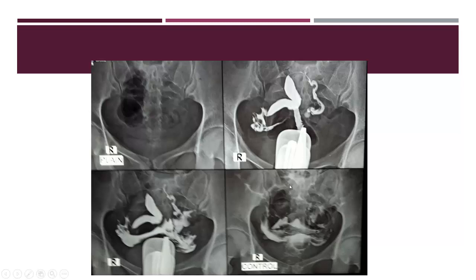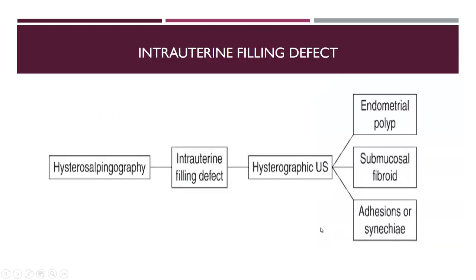Another case, duplicated uterine cavity, and these are the normal fallopian tubes. So this is a subseptate uterus, but better to say duplicated cavity for ultrasound. Then we came to the end of contour irregularity, we just missed the adenomyosis. We will see a slide for adenomyosis later on.